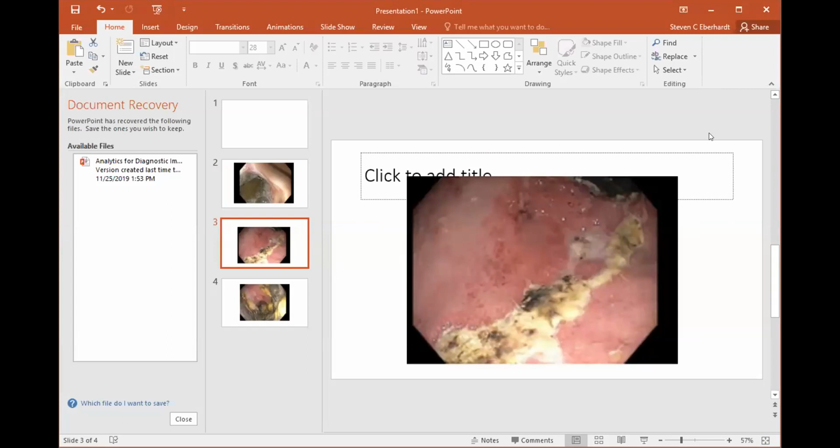The patient was treated conservatively. It was a young woman. She had 2 endoscopies. They elected not to do an operative management of the gastric content. And the last notes I read, she was discharged because she was hemodynamically stable, and the bezoar was being treated orally and via NG tube. Coke Zero was being administered, and apparently Coke is acidic enough to dissolve gastric content, and it's a known treatment for bezoars, which I didn't know until I was reading the notes.